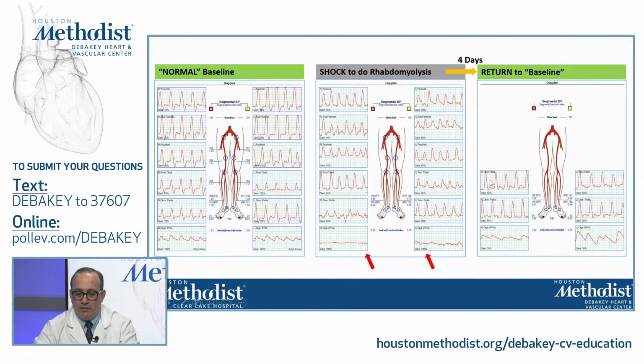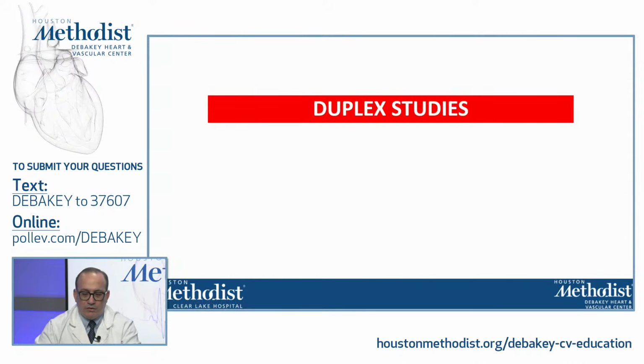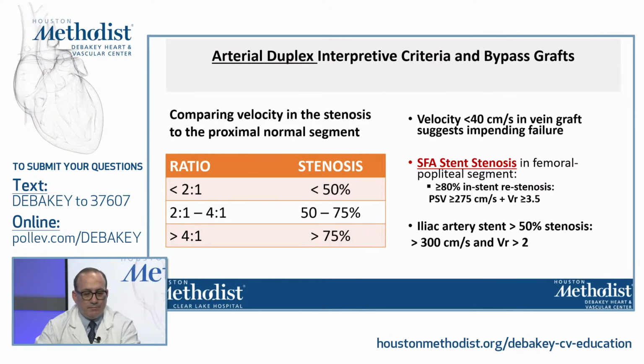Four days later, we obtained another physiologic study, just a limited version of it, and waveforms went back to almost normal, as she was at her baseline. And toe perfusion improved remarkably. So this is super important. Now let's switch to duplex studies.